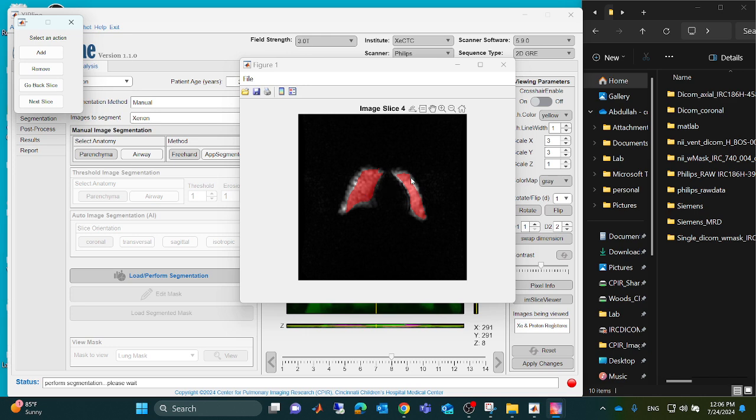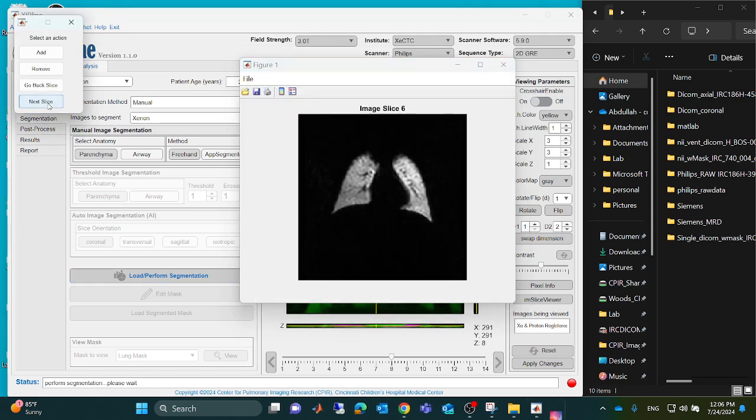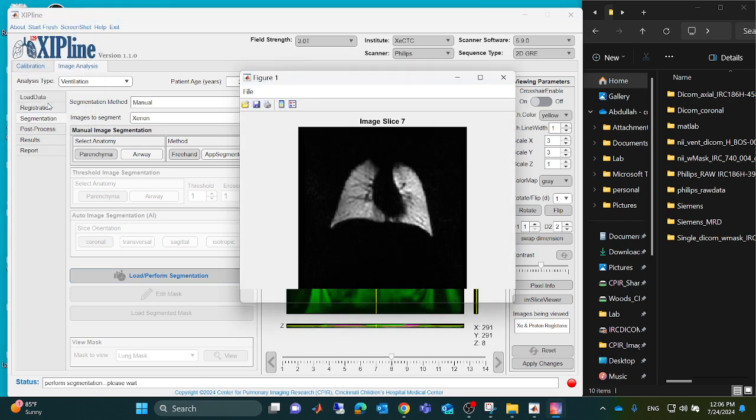I'm gonna skip this one, but once you finish this one, you do part by part until you finish the entire lung.